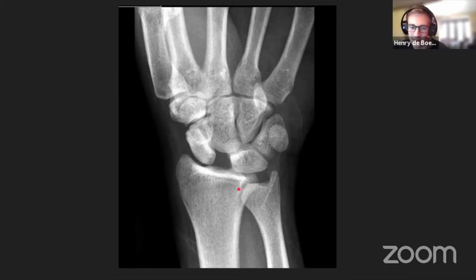Okay, so our usual pattern, tracing the bones proximal to distal. Okay, so some concern for capitate fracture and little finger fractures.